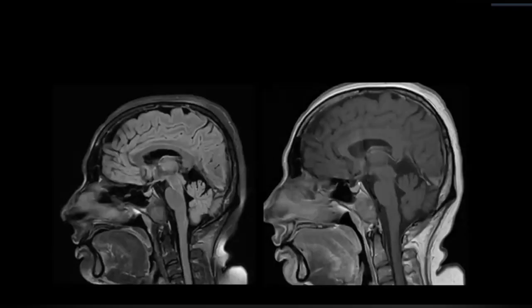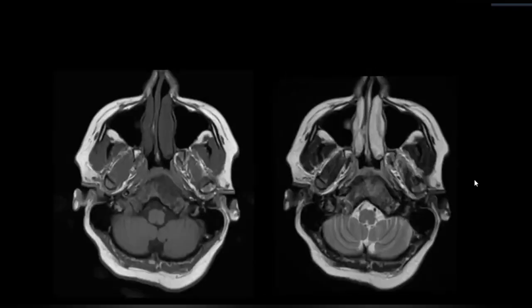I showed you the last case, and that was on the spectrum of bright lesion, very bright on T2, just like a light bulb. And this one is dark, okay? So yes, sir, it was not high on T2. This is on the other spectrum. At the same time, if you see the bone is not destroyed, it is expanded.